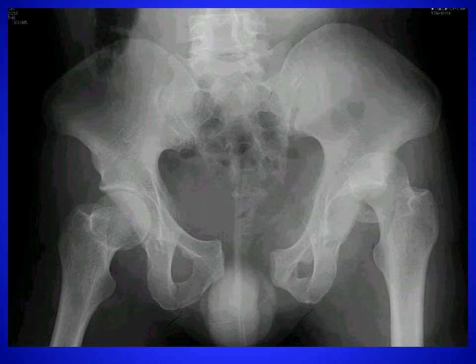You should be able to identify anterior and posterior disruption of the pelvic ring on the left, suggesting an open book fracture. There's also a dislocated left hip. If you look closely, there appears to be a bone fragment in the left acetabular area, possibly originated from the acetabulum or the femoral head.